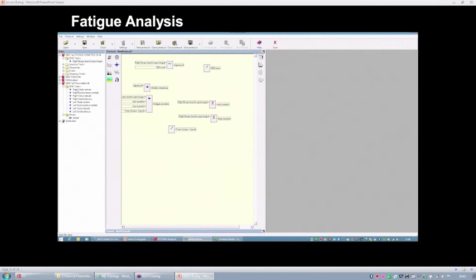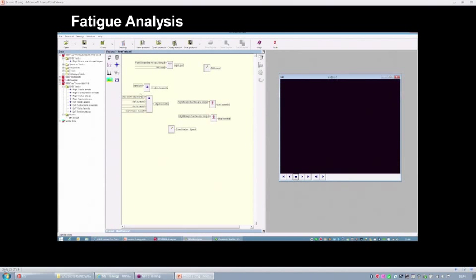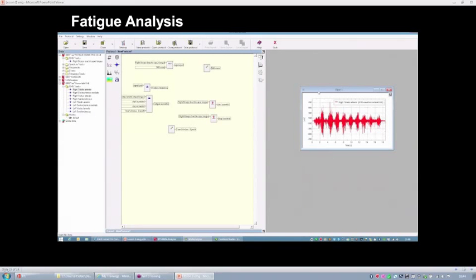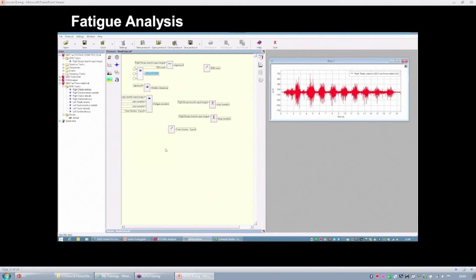Now I want to show you another example. I'm sorry, I think that maybe you cannot see the video, but in this case I want to show you an example where you don't investigate fatigue during an isometric contraction, but during a repetition of contractions. So in this case, you have other two blocks that can be used to perform the investigation of fatigue within the EMGAnalyzer application. I'm going to use this.